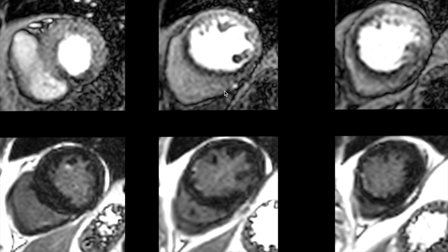So these are areas of peri-infarct perfusion defects, suggesting that there is infarct as well as ischemia in these segments. Gibbs artifact or rim artifact is something which we do encounter in stress perfusion imaging, whereby there is a thin rim of dark signal, often circumferential, at the interface of the endocardium and the LV cavity. These are easy to differentiate in most cases because they are razor sharp and do not fit any vascular territory.